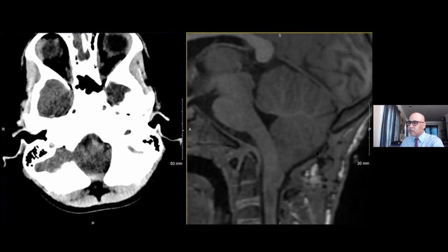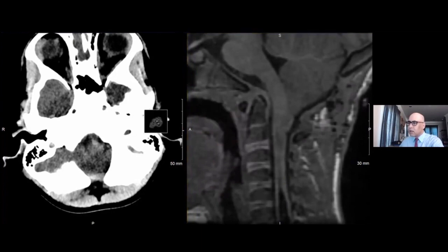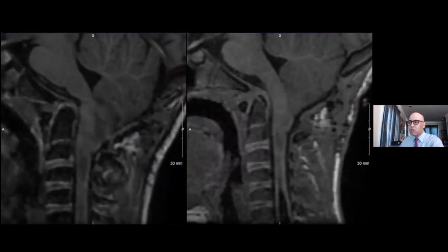This shows a successful bony decompression, but we can still see portions of the syringohydromyelia. But 6 months later, the syringohydromyelia has resolved. So the bony decompression without the duroplasty was successful in relieving the syringohydromyelia, and equally, if not more importantly, the patient's symptoms had resolved.